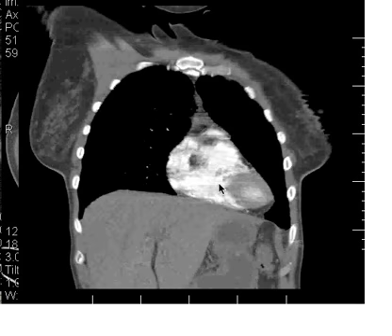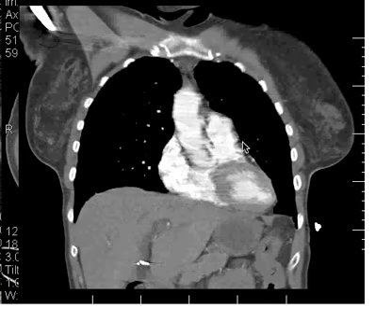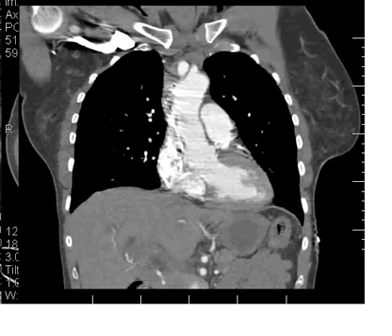So here you see the right ventricle is coming out as the pulmonary outflow tract, and we follow it back, and it becomes a little more clear as a tubular structure. And then, as it dives under, here we're coming into the arch, because you see the great vessels coming off the arch. So here is the beginning. We're going from front to back. So here is the first few cuts through the aortic arch. Here is the main pulmonary artery diving back, and it's going to branch under the aortic arch.